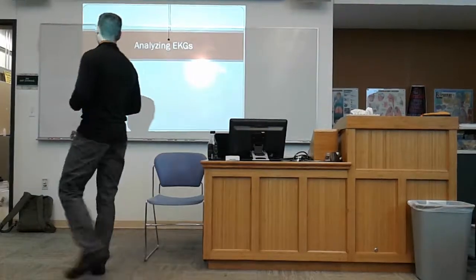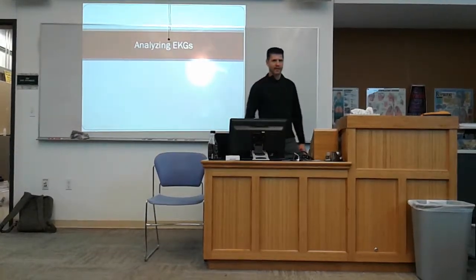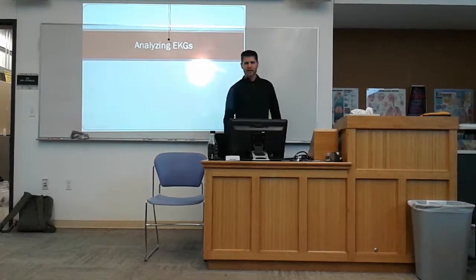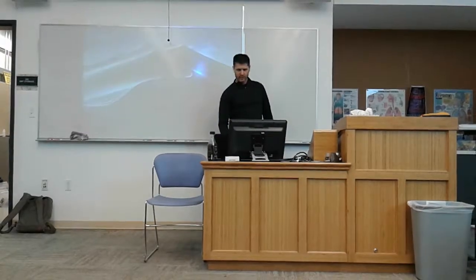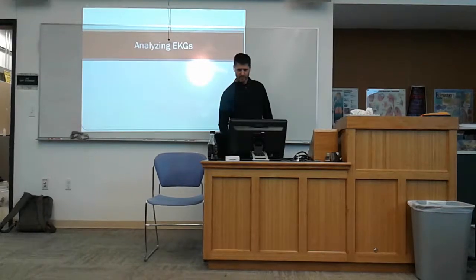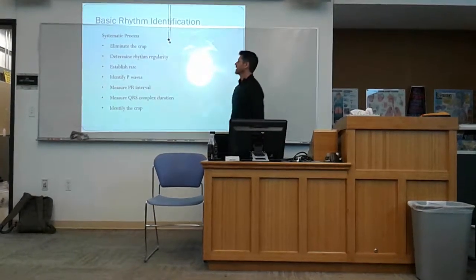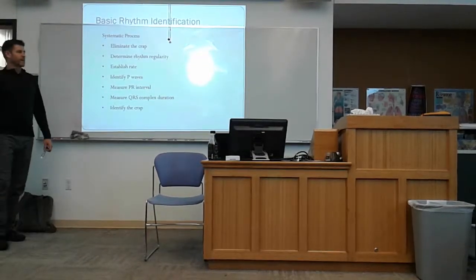But for the moment, if we take our 6-second strips, which is that packet that you have with 6-second strips, and you're about to get a thick book of a whole bunch more, when we look at that, there's an approach to every single one of those that you want to take. The first approach in analyzing these things is to go through this step-by-step process of how you look at them.